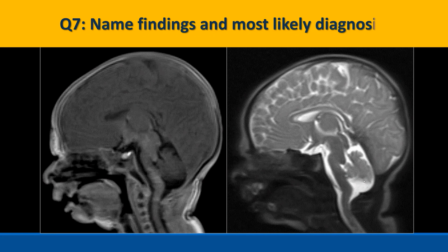And the medullocervical junction looks odd as well. It's kind of kinked. Yes. About the midbrain? It's also kinked with the pons. It's not in a normal location either. It's inferiorly displaced.